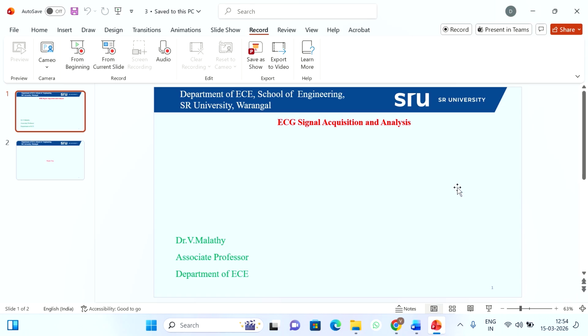Now I am going to simulate using the Google Colab platform. Now I am sharing the screen.